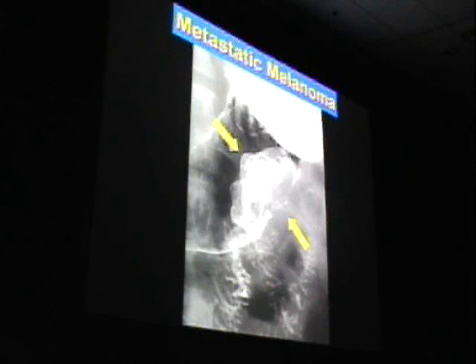Very peculiar looking irregular lesion. Hard to tell exactly whether this is mucosal or submucosal. Not very well seen on this one particular image, but the very smooth, lumpy, bumpy margin makes me think that this might be a submucosal mass, and this turned out to be metastatic melanoma.